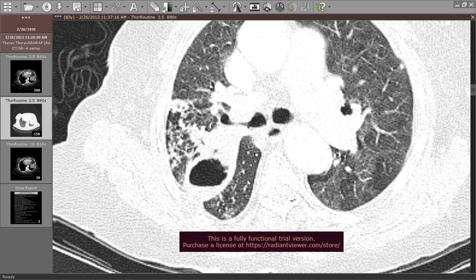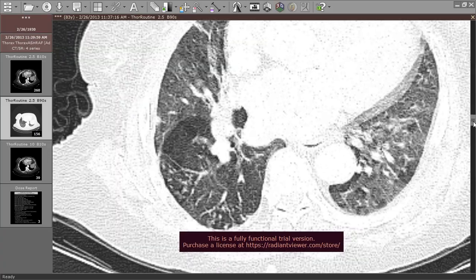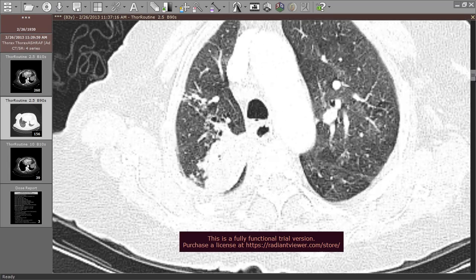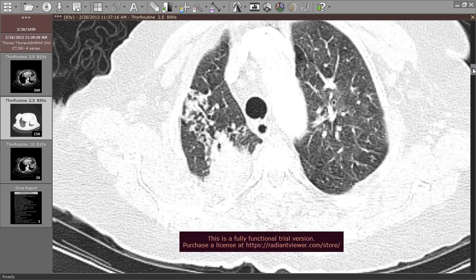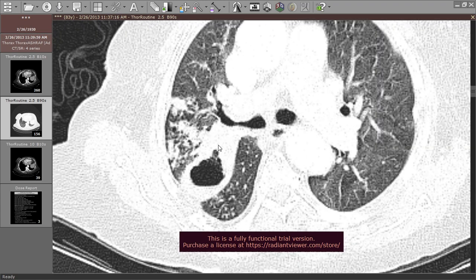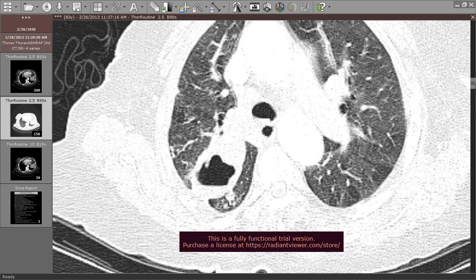This means that I have a cavity and bronchiolitis as well. Of course, I have to suspect bacterial infection with a gas-forming organism, but if you look carefully for the presence of the apical fibrotic changes, you may think of old TB. Also, the location of this cavity in the most lower part of the right upper lobe, in the mid-zone of the lung, you have to suspect what's called reactivation of old TB.